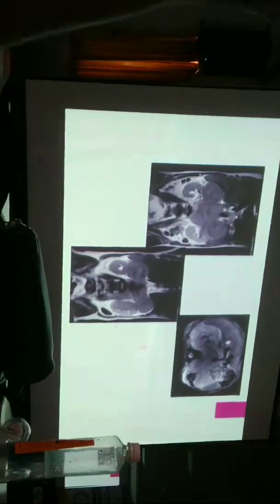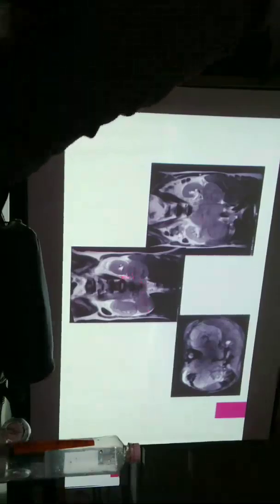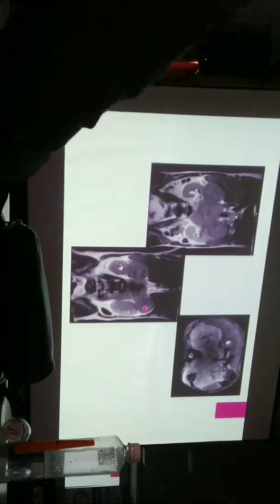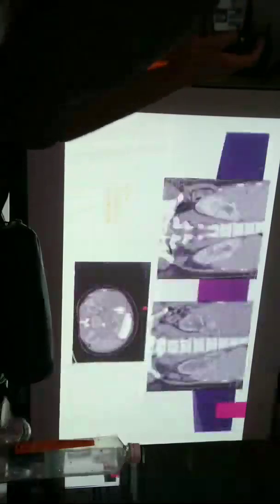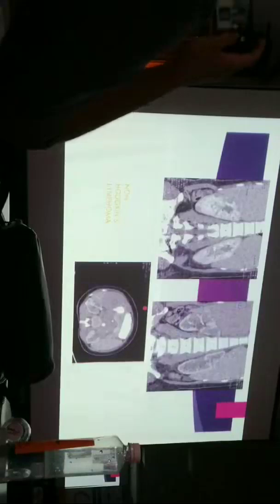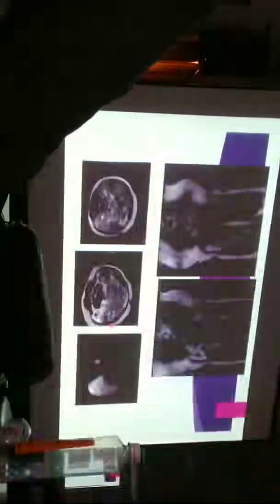And these are the coronal images. Besides the kidney, you can also see adrenal lesions. So this is a lymphoma that involves both the kidney as well as the adrenal glands. Bilateral adrenal gland involvement is there due to lymphoma. This is another case of non-Hodgkin's lymphoma that shows multiple hypodense lesions, which is seen in the CT urogram image, with multiple retroperitoneal lymph nodes.